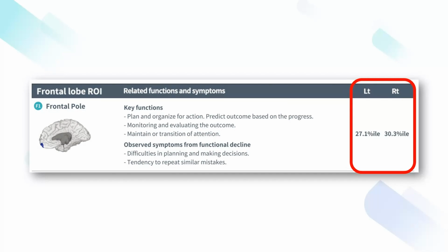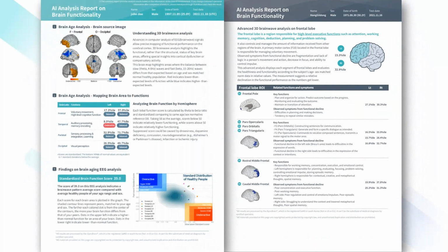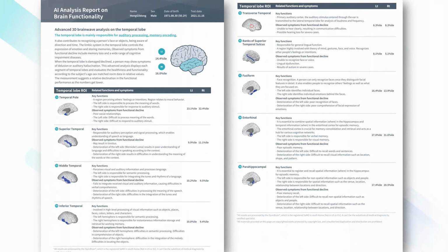So an important thing to note when you're going through this part of your brain is the brain is a very complex network. So just because one of these scores is low doesn't necessarily mean that you're going to have troubles with that region. And like I mentioned earlier, the brain is very compensatory. So if part of your brain has a low score, probably the areas around it are picking up the slack. We can also imagine a lot of these low scores are due to head injuries, drowsiness, or different medication type effects.